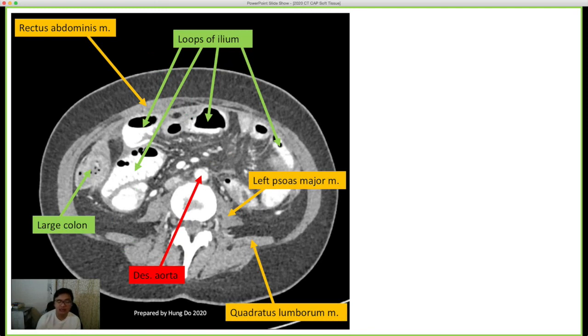I just find them really interesting to say because, you know, the left and right psoas muscle, I think it's very nostalgic because when you first learn x-rays, one of the first things that you learn is to identify the left and right psoas muscle on your abdomen x-rays. If you can see the left and right psoas muscles on your abdomen x-ray, it is a good indication that you have adequately exposed the image.